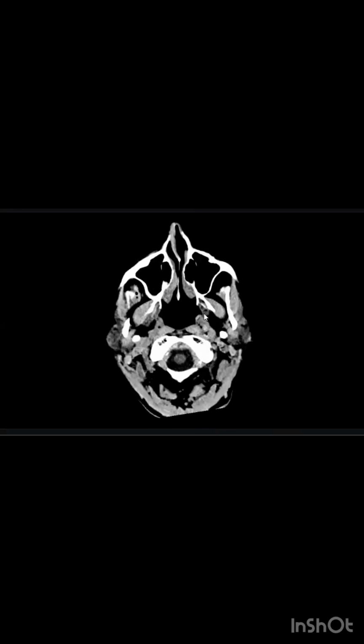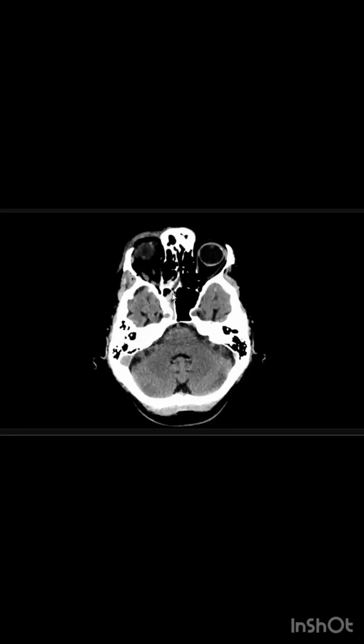Yes, sir. This is a case of trauma, so you have to check the mastoid, the orbits, and the sinuses. You can see here there is an air-fluid level and hyperdense content, which means hemosinus, and also here in the right sphenoid compartment. So you have to suspect there is hemosinus, and when I asked you to look at the orbit, you detected the superior ophthalmic vein engorged. In the case of trauma with sphenoid sinus fracture and hemosinus, you have to put the possibility of carotid cavernous fistula.